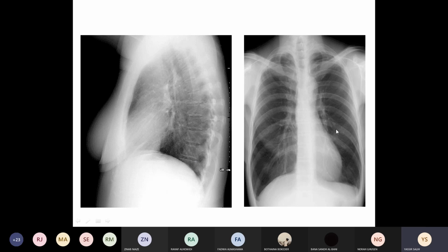Again, this is a chest X-ray. We showed it just so you know to look for the normal lung, trachea and diaphragm on the frontal and lateral film, and the increased translucency of the vertebrae as we go down, the right and left hemidiaphragm and so on.